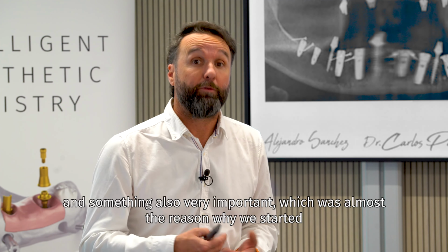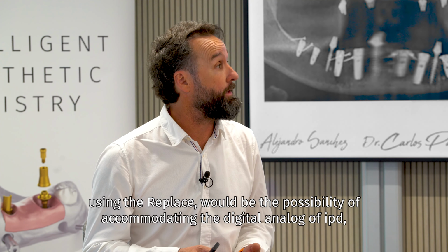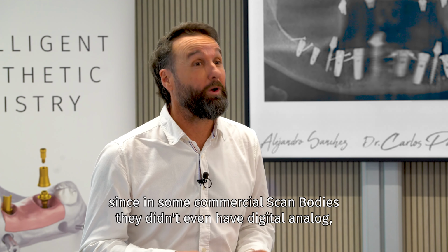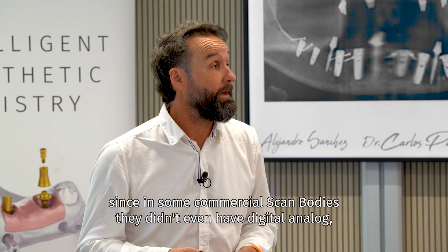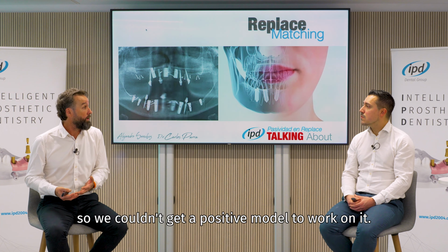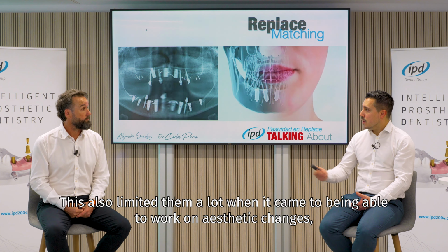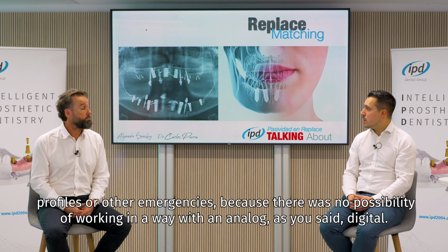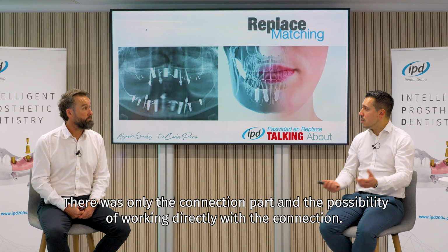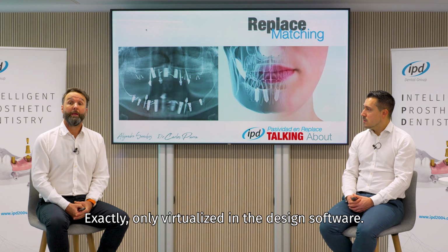And something also very important, which was almost the reason why we started using the replace, would be the possibility of accommodating the digital analog of IPD, since in some commercial scan bodies they didn't even have digital analog. So we couldn't get a positive model to work on it. This also limited them a lot when it came to being able to work on aesthetic changes, profiles, or other emergencies, because there was no possibility of working in a way with an analog. As you said, digital, there was only the connection part and the possibility of working directly with the connection. Exactly. Only virtualized in the design software.